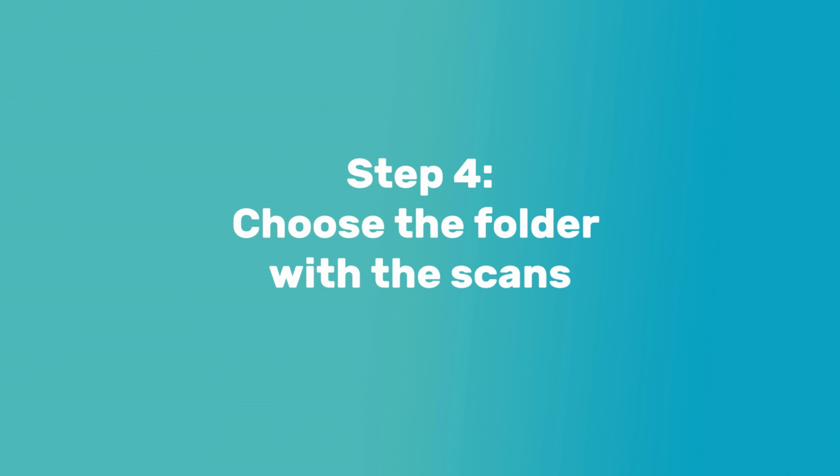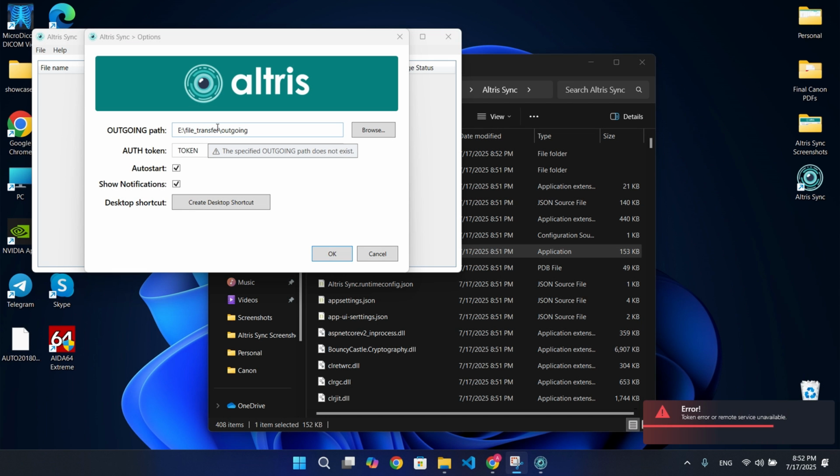Now we have to choose the folder from which the app will transfer the exams from, the one you previously created, in our case the folder called Altris Scans. Click Browse and choose the folder.